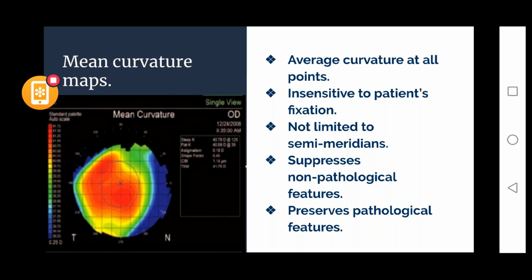Okay, so in that you will not get any confusion. But if you're talking about just the topographer, yes, you might get confused about what is happening. If you look at the reports very critically, and if you are smart enough to understand why this vertex is displaced, you can tell the surgeon, or if the surgeon observes this, the decision can be taken based on this about the refractive surgery.